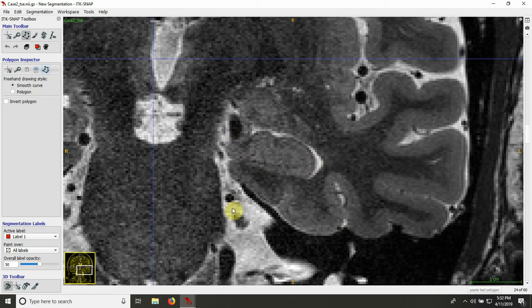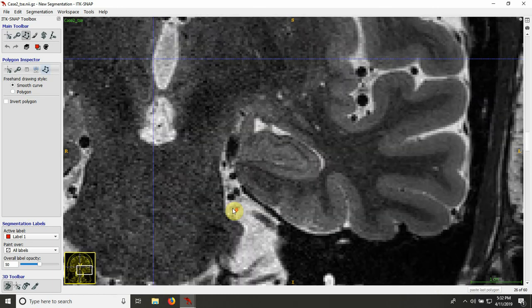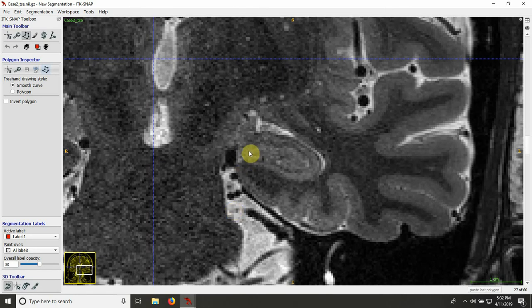And this is a vessel, I want to point that out. So going further posterior again, you can pretty clearly see the borders here, although it's a little bit noisy. And then again, the dark band would be this one. And these adjacent regions are also pretty clear.